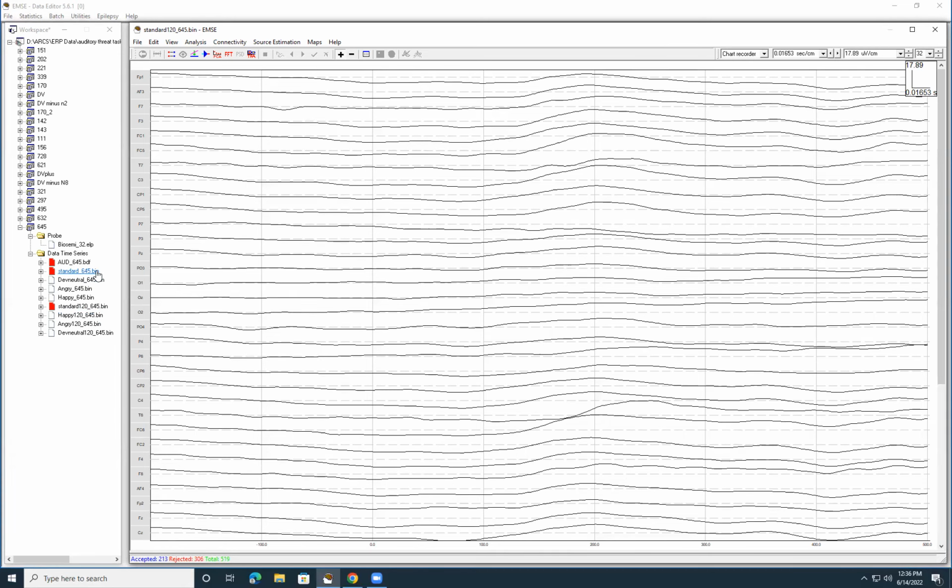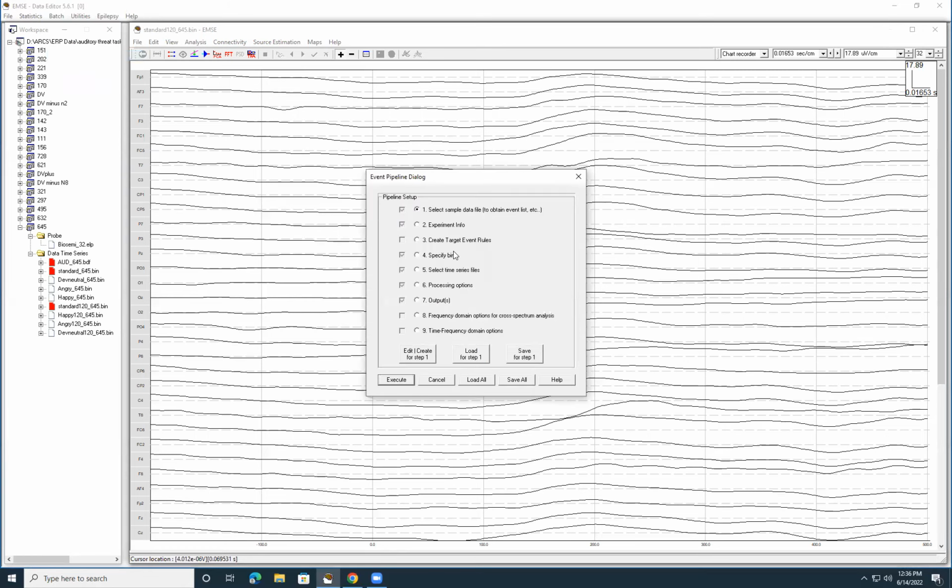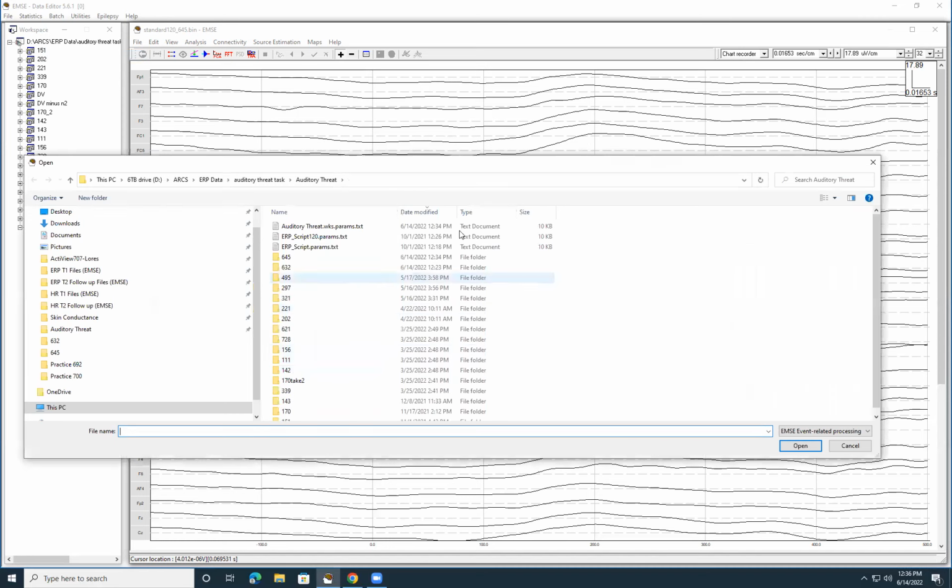So the reason why I wanted to make the video and show this and explain all this is because it can be confusing when you go to batch, and you go to load all, you see these 2 very similar names and it can be confusing as to know which one to do. So for now, since we're not sure what we want to use, do both. And so you're basically just batching it 2 times as you would normally batch.